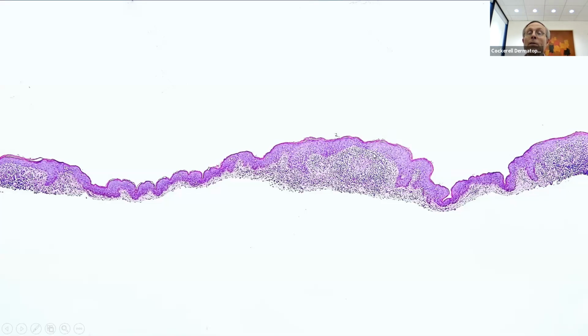And what do we know when we think of inflammatory cells at low power that are pale? They're histiocytes. And then this guy is like grabbing here. He really likes this little collection of histiocytes. He's giving it a hug. Okay, so we've got a little ball and claw going on with histiocytes, shave biopsy. So there's really only one thing that can do this, one entity. Hopefully you all knew what that was.